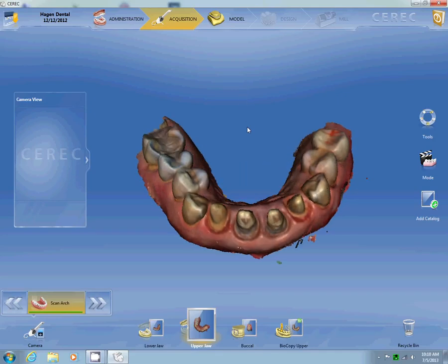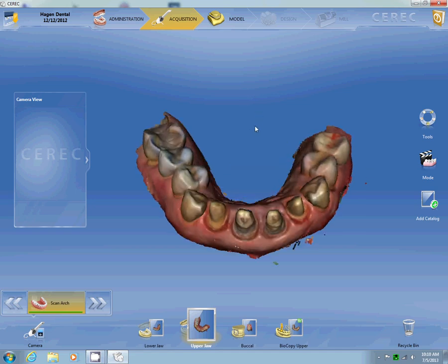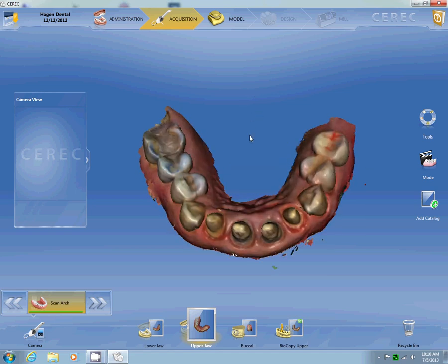As you're learning your Omnicam here, we've got a couple of cases that may help you gain some experience quickly. This case has a few problems in it. You're probably going to encounter these as you go down your Omnicam trail here, so I thought a couple of workarounds would be good. So here we go.